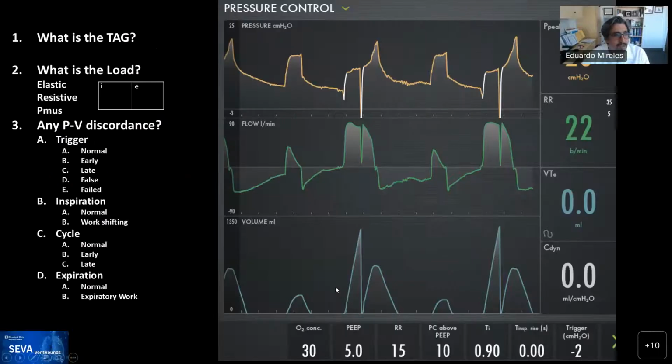All righty. So this is the first waveform that we have for today. I wonder if there's any of the attendees that wants to give it a try and read this waveform. Patrick, you want to give it a try on this one? Or anybody else? I know that sometimes it's challenging to unmute. All right, I'll warm you up and then we'll answer questions as they come.